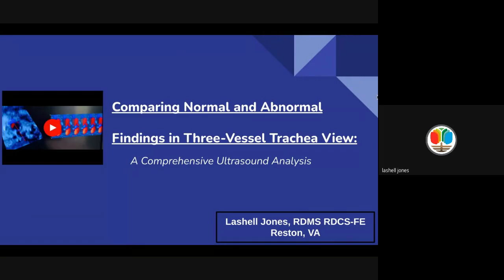Hello. In today's lesson, we will compare normal and abnormal findings in a three-vessel trachea view. Here is a STIC and M-mode of that. Here's a three-vessel trachea view. I just wanted to show you, this is one of a new technology that is on our GE machines. It's just known as STIC and M-mode. So I just wanted to give an example of that, but let's get started.